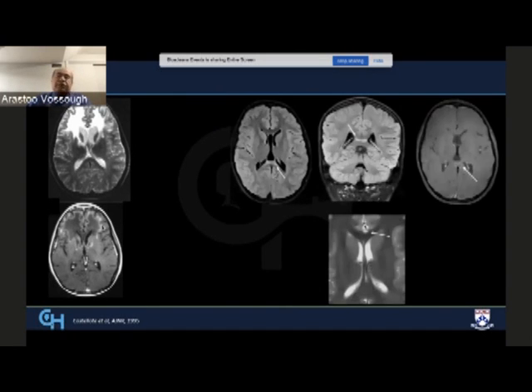Now, there's screening for patients with known mutations to look for early changes, because patients may be candidates for a transplant. So in these screening examinations, looking at the earliest changes, for example here in the splenium, becomes very important. By the same token, sometimes they can start anteriorly. It's upon us to look very carefully and in detail in all areas that may be involved. So this is a patient where the start of the disease is in the genu of the corpus callosum.